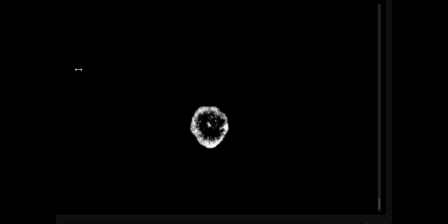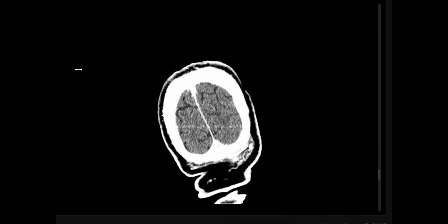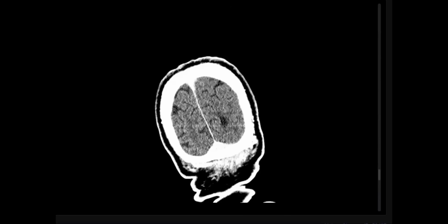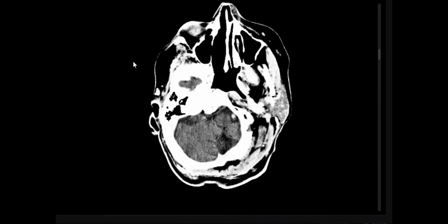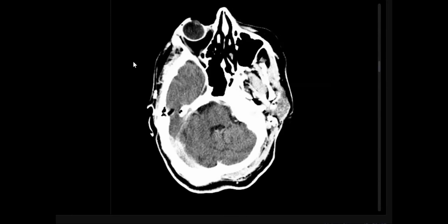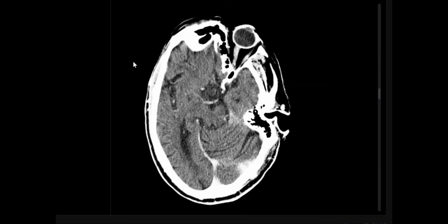showed some changes on follow up. Let's see what happened here. I'm sorry, a thrombectomy, not thrombolysis, a thrombectomy. Yes, sir.